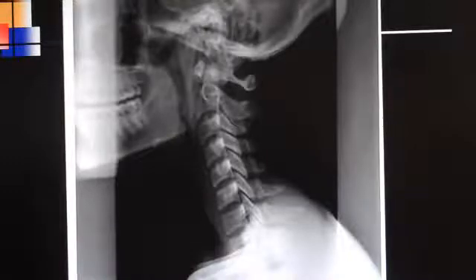And so the first one that we're starting with today will be the lateral cervical view. I want to just go through, this happens to be a digital x-ray, but it's very clear and the images are very clear. And so I want to go through the lateral cervical view, just pointing out structures.